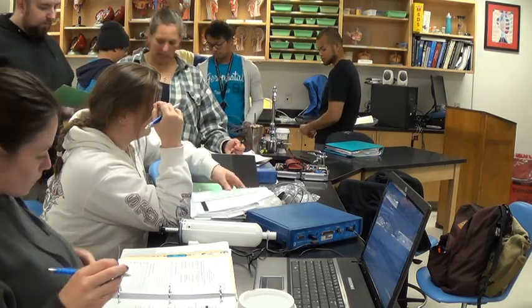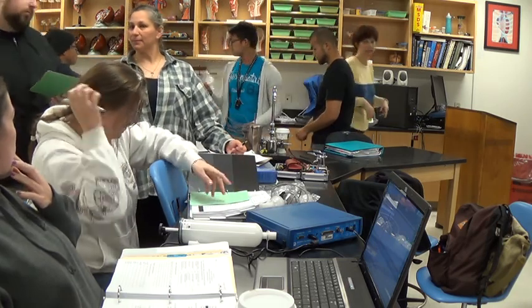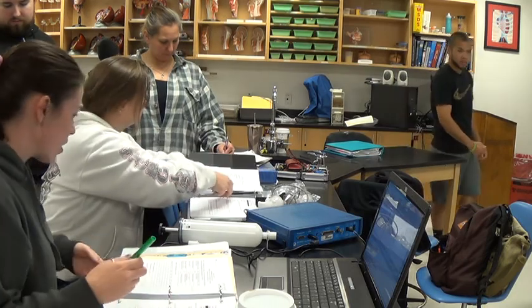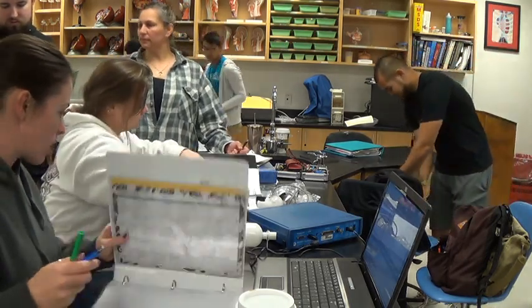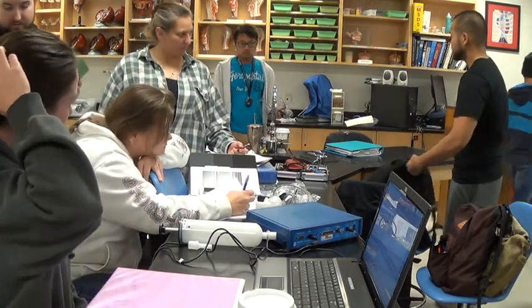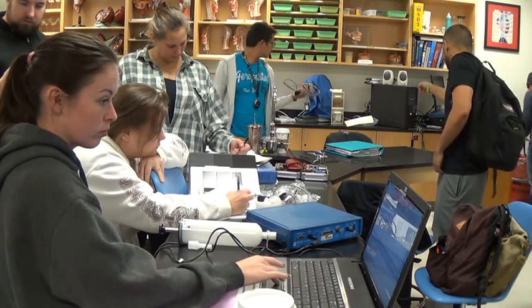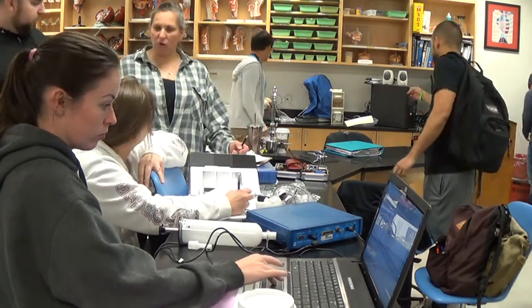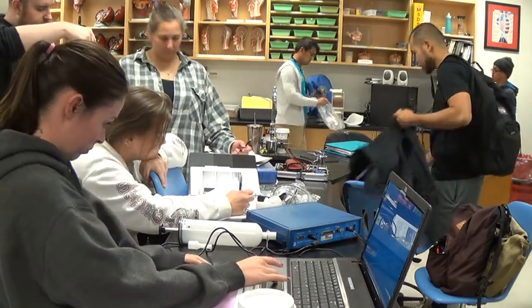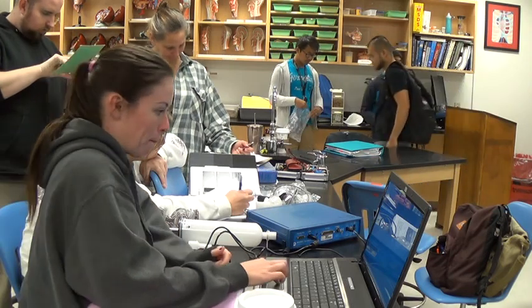I thought that's what she said to use this for, but you guys said she said to use the vital capacity. Well, it says population chart, and it does say to use it for vital capacity. Well, then what did it say for the 4, 6? So we use the green chart for the forced expiratory volume or vital capacity? For the forced expiratory volume. But it gives us numbers. Sorry, it says vital capacity. Oh okay, that's what we thought. Hold on. So what I don't want is 4,800.